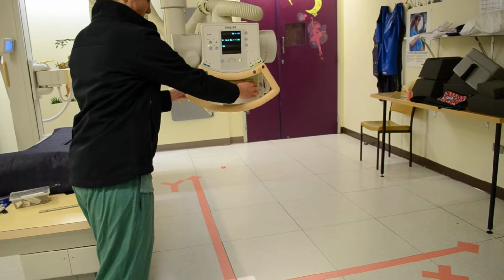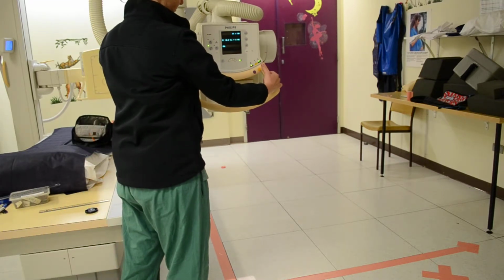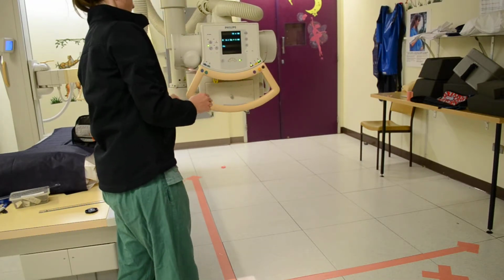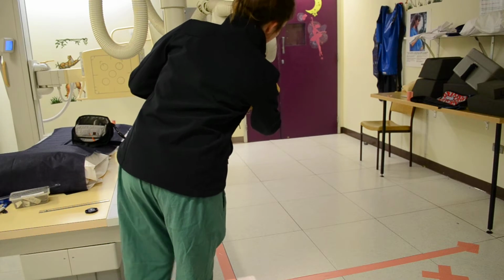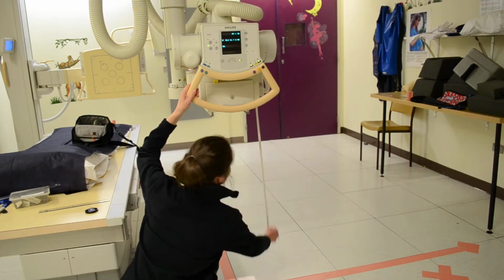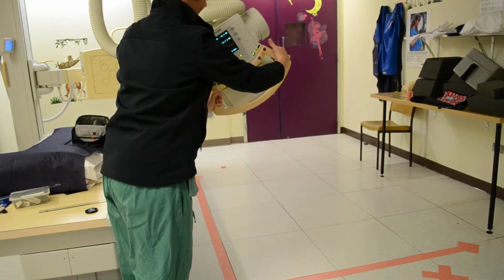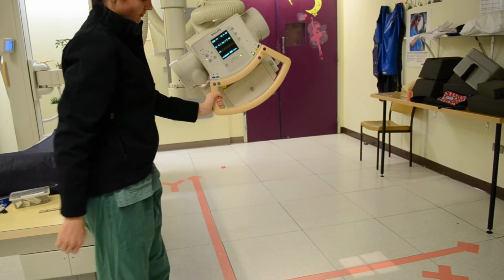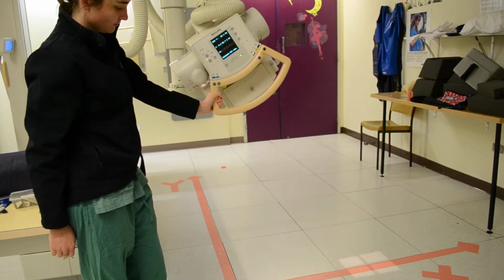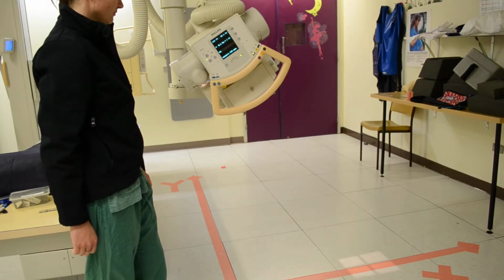Now we have a need when we're working to be able to angle the beam. So we've drawn an X and a Y axis on the floor here, and say we angle the beam 30 degrees along the X axis. You can see where the centre of the X-ray beam is, vertical at the moment, and if we angle the beam 30 degrees, the centre of the field will be at 30 degrees along the X-axis, and that's fairly straightforward and it's something that we would do every day.